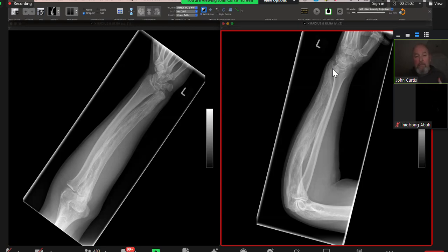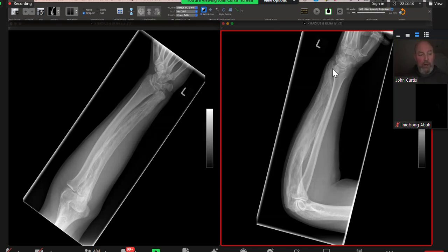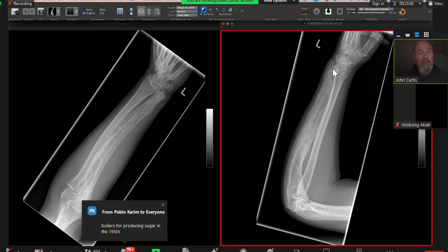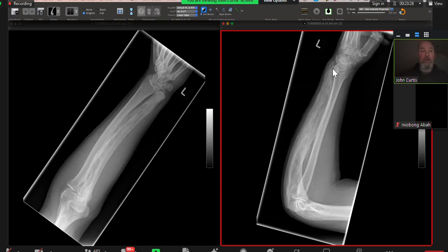But the examiner might want you to just knock it for 6, and some examiners may not want you to knock it for 6. I would want you to knock it for 6. But you have to understand what the examiner that you've got wants, because the examiner you get in the exam might be slightly different to me, and they may want lots of description. But I kind of want you to just knock it for 6. Yeah, that's a classical Paget's in an unusual position.